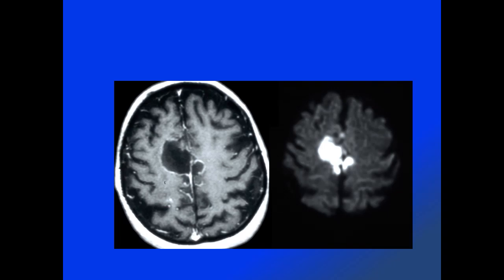In a different patient, near the vertex on T1 weighted image, there is a hypointense mass with a signal similar to CSF in the right parasagittal location, possibly smaller on the contralateral side, with a diffusion-weighted image demonstrating prominent hyperintensity of these lesions, again consistent with an epidermoid tumor.